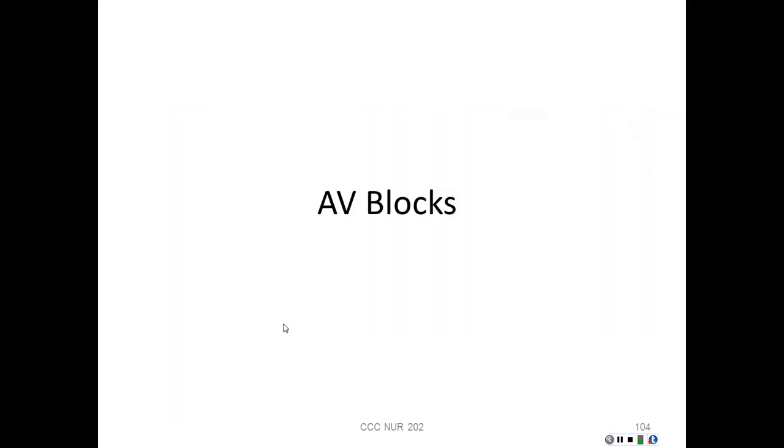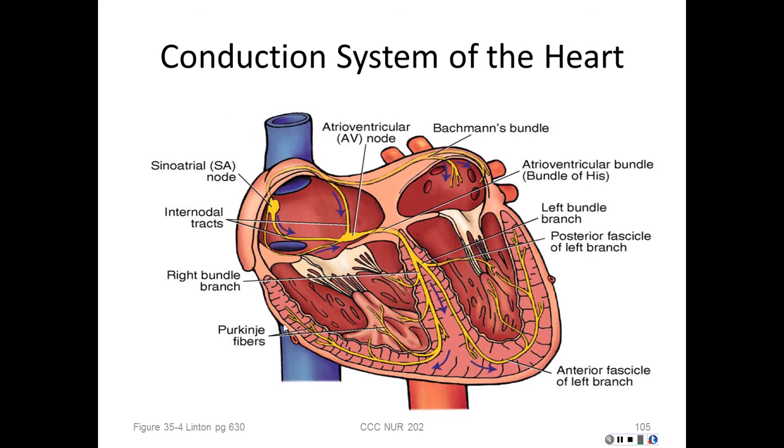We're going to move into AV blocks. Again, this semester, the only AV block you're going to be tested on the unit test is the first degree AV block. But you may see second degree and third degree AV blocks as part of the HESI exam. Remember the conduction system.